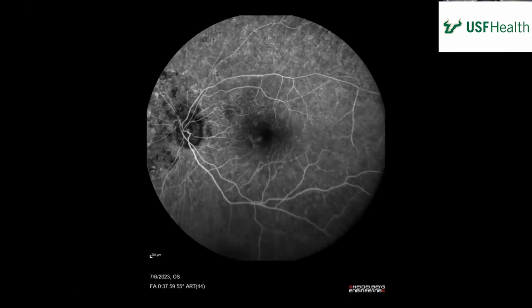So I think it would be leakage in that situation also. And then the circulation. Okay, all right. And definitely delayed circulation. And if you look all around, I try to look at it as a forest, you know, is there a normal transmission through the outer retina up top? No, it seems like that's the area where there was the arterial narrowing.